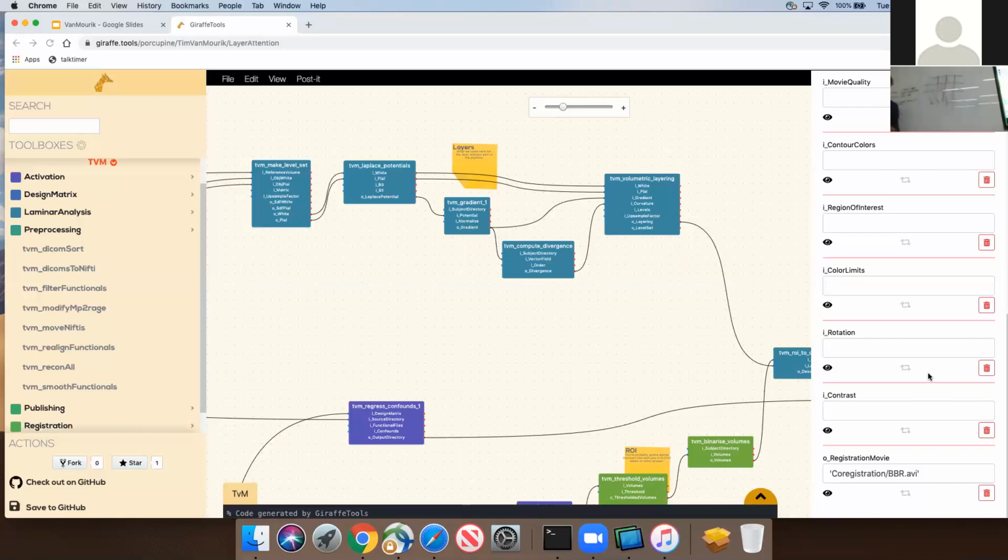then the signal here will be some, well, you can do it in different ways. I can use a nearest neighbor interpolation and say, well, my signal here at this point is always just exactly the signal intensity of this voxel.